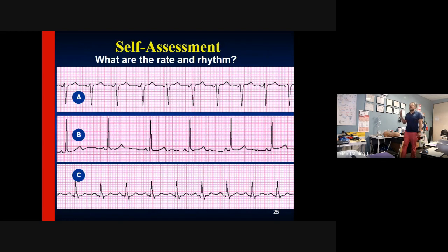All right, self-assessment. You're going to write this in the chat for me. Tell me what are the rate and rhythms for A, B, and C. You answer that in the chat, and we're going to answer later on in our presentation.